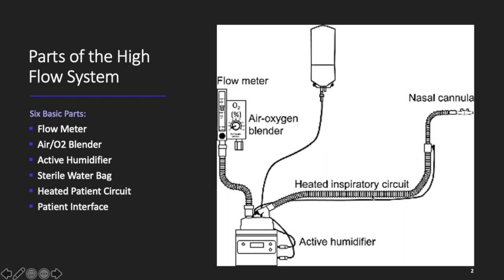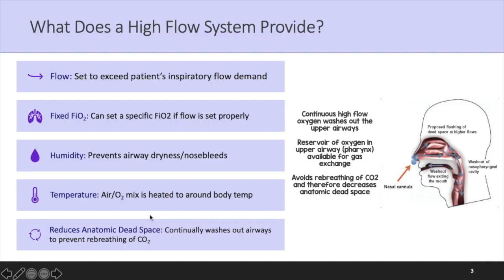We then have our heated inspiratory circuit, which then attaches to our interface. These are usually heated wire circuits to prevent too much condensation. We can have nasal cannula interfaces. We can also have tracheostomy interfaces as well. So it just depends on your manufacturer.